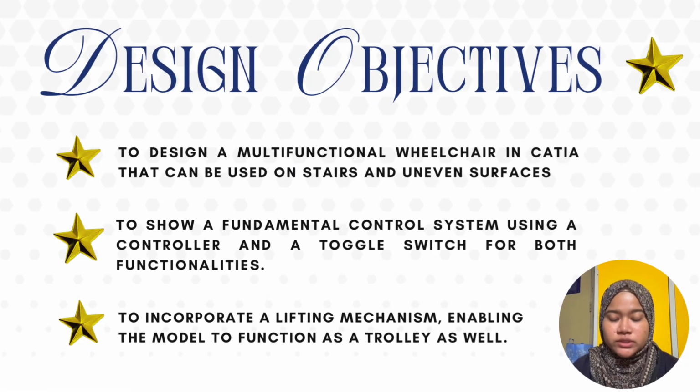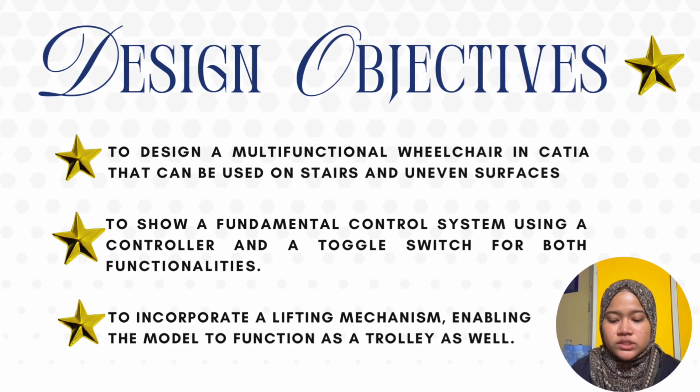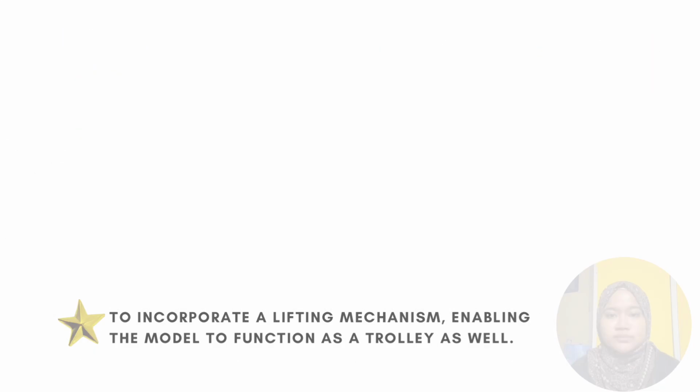The objectives of this mini project are: first, to design a multifunctional stair climbing wheelchair using CATIA that can operate on stairs and uneven surfaces. Second, to develop a basic control system using a controller and toggle switch for its functionalities. Third, to incorporate a lifting mechanism that allows the wheelchair to function as a trolley for carrying load.